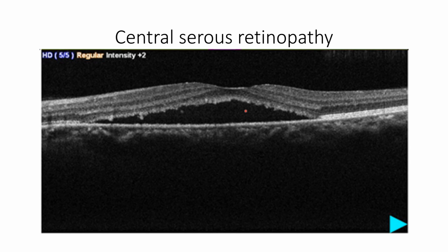And this is again because the fluid collection in this space spreads easily, because the adhesion between these two interfaces is much less when compared to Bruch's membrane and retinal pigment epithelium. So when you have a PED, it will be more localized and convex like this. And when we have CSR, it will be more shallow and spread out the way this is.